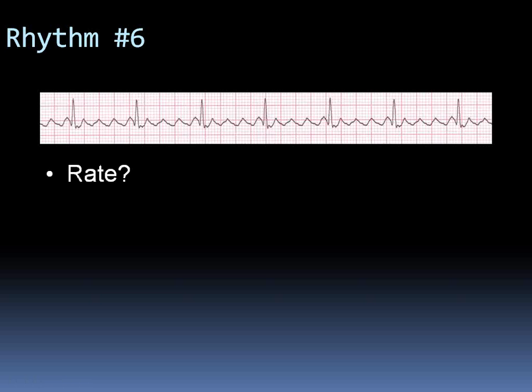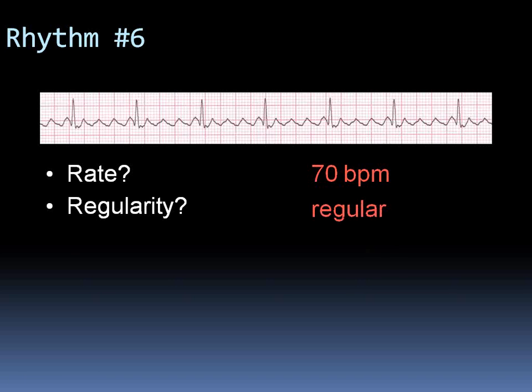Okay? We went over this. And the other thing about atrial flutter is that this rhythm is very regular. You know, when somebody has atrial fibrillation, the rhythm can appear to be irregular, and just by checking the pulse, it will be difficult for us to say whether somebody is in sinus rhythm or somebody is in atrial flutter because it's so regular, you see. Okay?